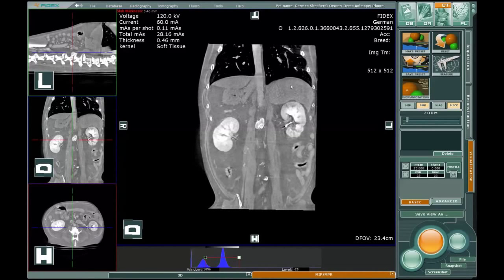Click on Slice, which is a default, or Slab in the middle of the right screen. The thickness of the slab may be controlled by overtyping the slab thickness parameter shown on the left top of the main window. Thick slabs can also change their width in the small windows by moving the broken lines.